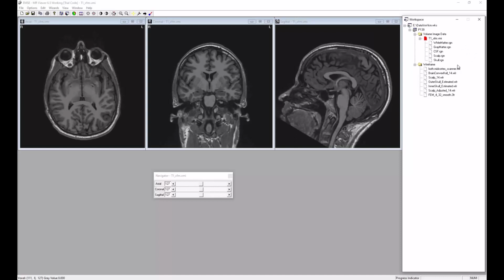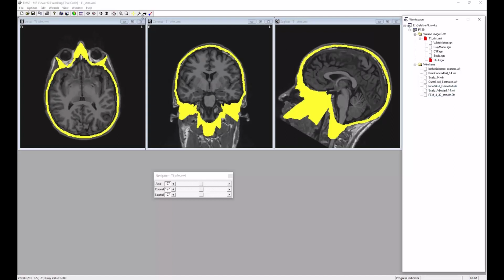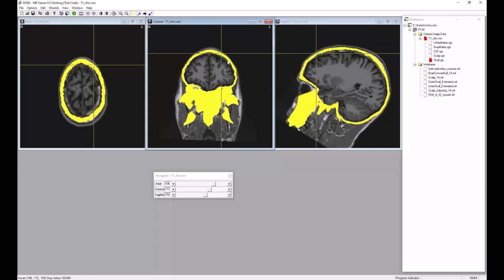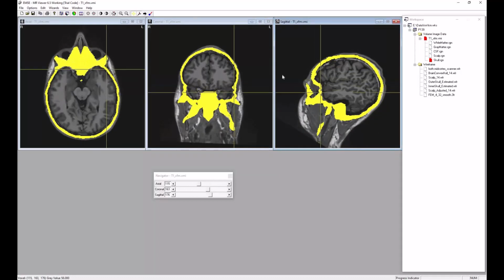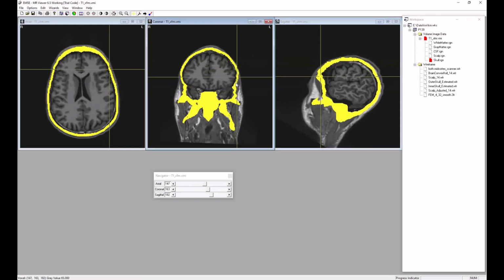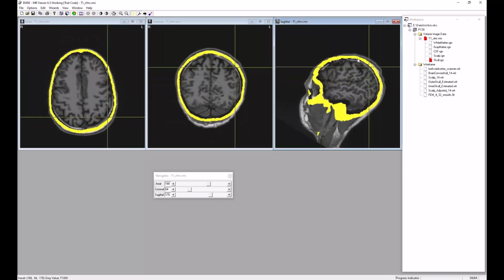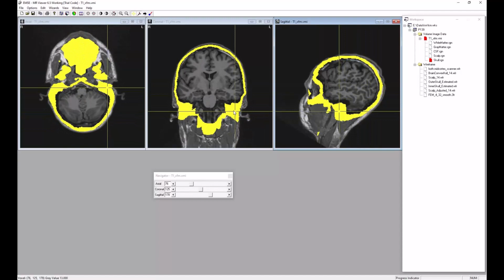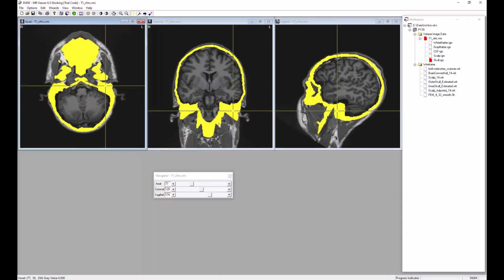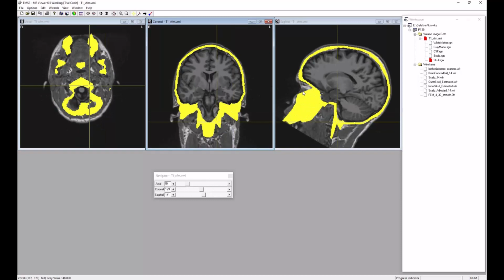We've got the skull, which is the main one that we were trying to get. And notice that the skull now is not a fixed thickness everywhere. It varies. One of the approaches that EMSE used to take was to make a fixed thickness, but also you get cheekbones, you should get eye sockets here.